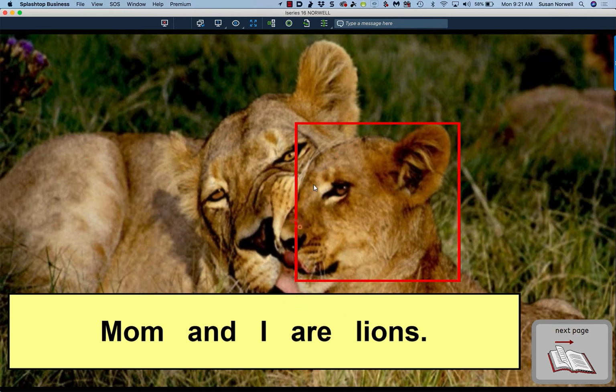And the original reason I did this was because there's this little girl whose mom posted and said, I think she's only looking at the middle. She might be looking at the middle long enough to activate things, but she actually might be using her eyes to get to the outside corners, and we're just not seeing it because it's so fast. And so it does kind of help to see what they're actually seeing.